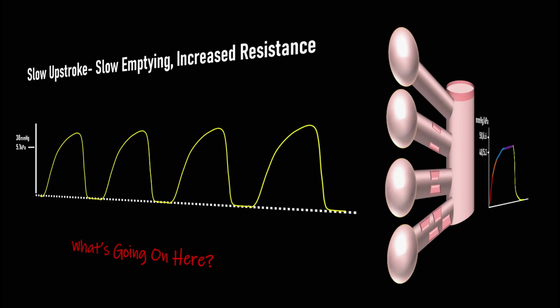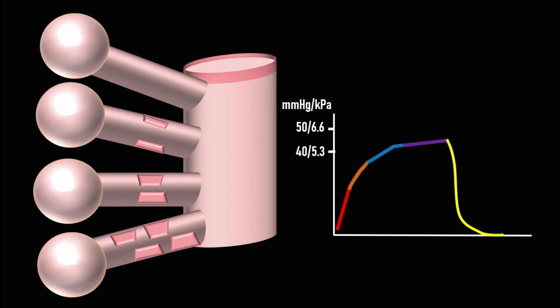And I'm going to illustrate this. This is a patient with COPD. Although the alveoli are normal, there is a variable amount of obstruction within the airways. And that means that there are different time constants for each different type of airway in the lungs. The relatively unobstructed airways will empty first, followed by the next least obstructed, and so on and so forth, until the most obstructed airway empties last just prior to inhalation.